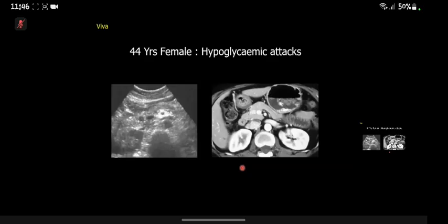There is no significant ductal dilatation that I see on ultrasound. On the contrast CT, just where the normal vessels are at the junction of the head and body, I can see another hyper-enhancing area, rounded in configuration.